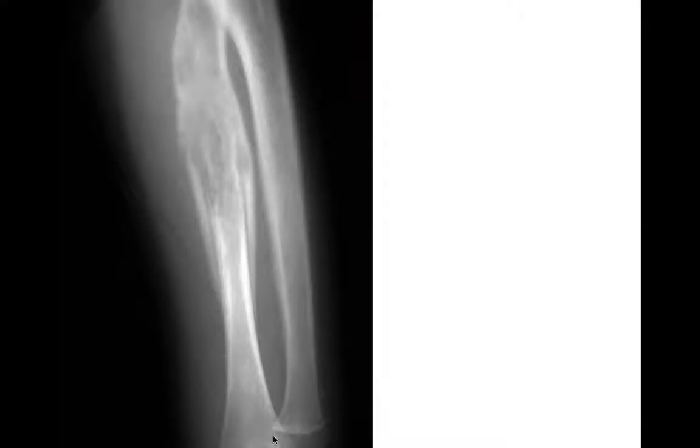All right, this was a child in this case. We see there's this geographic lytic lesion with a wide zone of transition right here, and around the lesion we see this solid heaped up periosteal reaction. The periosteal reaction is fairly non-aggressive appearing, even though the lesion itself, because of the wide zone of transition, looks a little scarier. So I think it's reasonable to consider more infiltrating processes such as a lymphoma or an Ewing sarcoma or infection. This case turned out to be a Langerhans cell histiocytosis, or EG, in the bone, but with a less aggressive, solid periosteal reaction appearance.